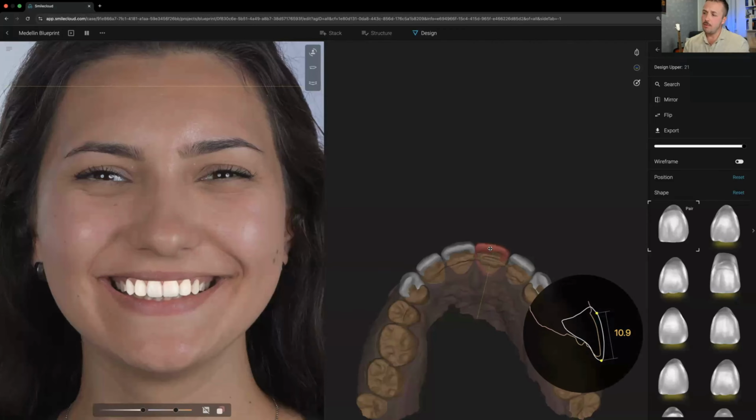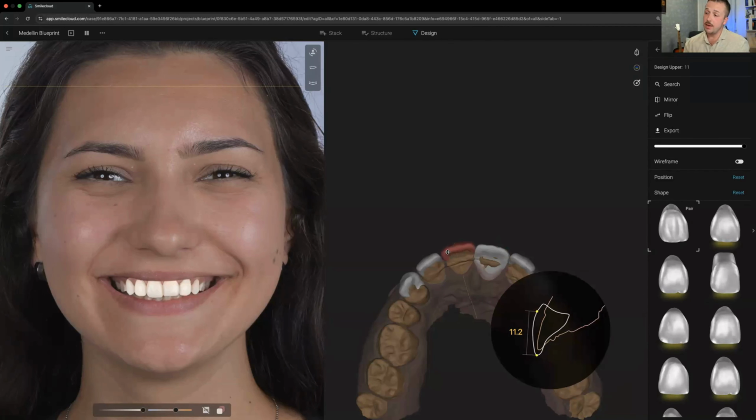So this is a powerful way of not losing time. Having everything ready, and when the patient decides, you can just proceed where you were left off. You don't have to see the patient again, just to make new photos or to make a scan or something like that. You just basically say, okay, we stopped here. Let's proceed down to making a mock-up.